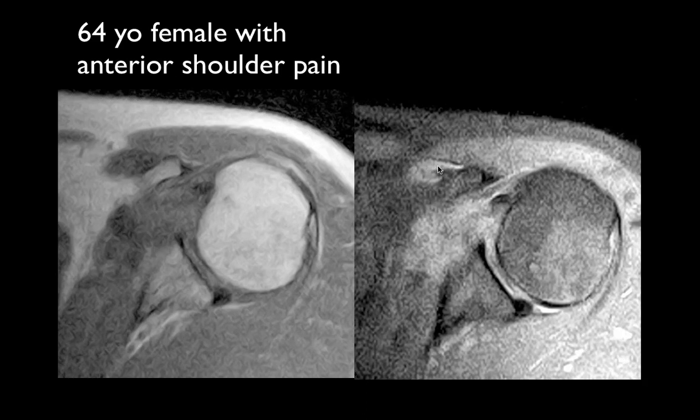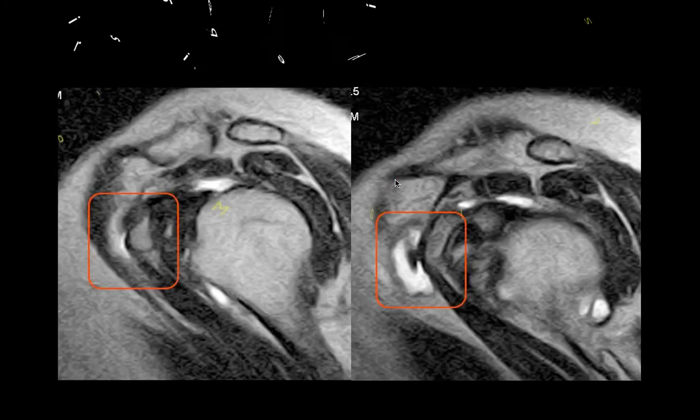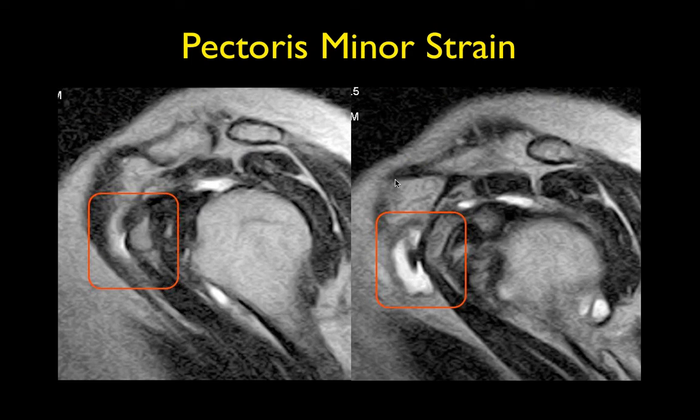Well, to really determine whether it's torn or strained here, I'd have to go back and look at the individual images to see whether you could follow the tendon through here. Here's the nubbin of the distal tendon. Most likely it's torn, and there's a little bit left here, but the tendon is torn there. But you really need to look at adjacent images and see. And I don't remember this case, but what did I say it was here? Well, I must have been able to follow it because I felt that it was not a complete tear, so I used the word strain. So in this particular case, quite irrelevant because you're not going to treat it. You don't treat these.